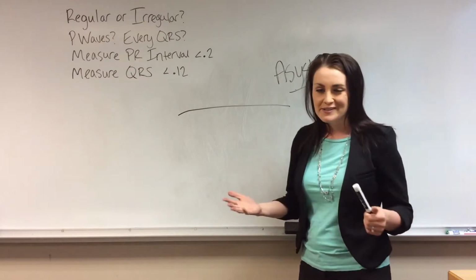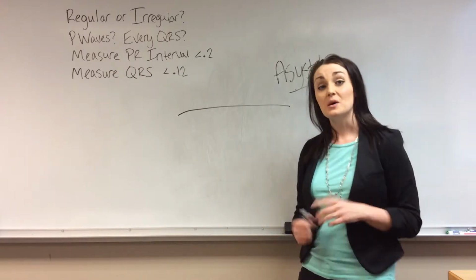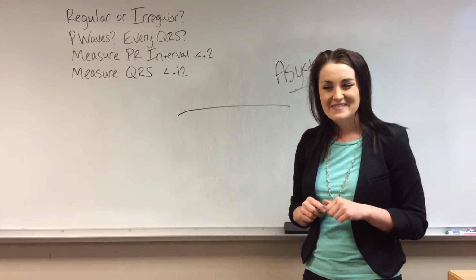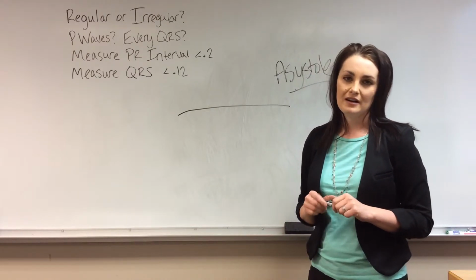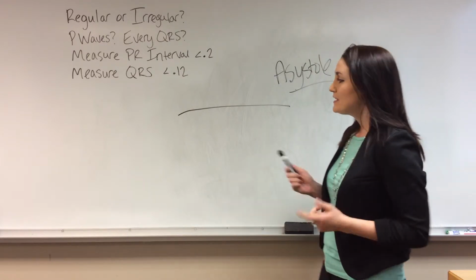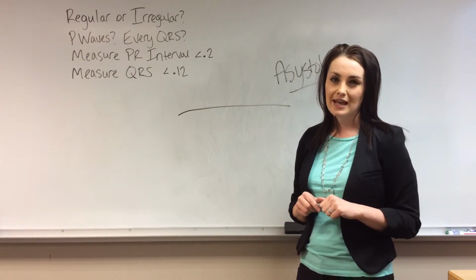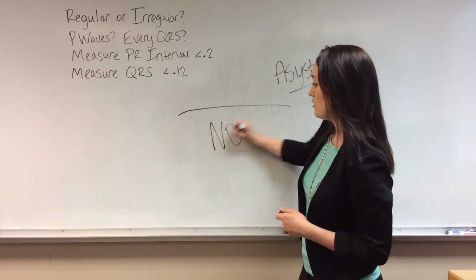Again, with this one, of course, you're assessing your patient right away. If you see this on the monitor, you don't want to jump and assume it's always asystole, because they could have a lead off. If they're sitting and talking to you, they are not in asystole. But as you assess your patient, and you would check for a pulse, and this is always pulseless, asystole is. So with this, good CPR, intubation, epinephrine, vasopressin, those ACLS medications again. The main difference is we do not shock asystole, so no shock.